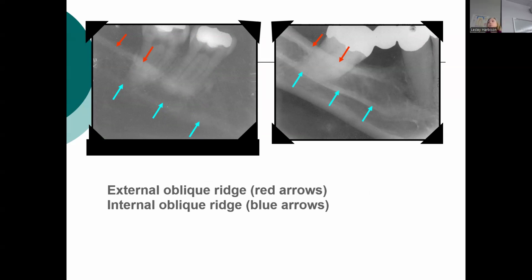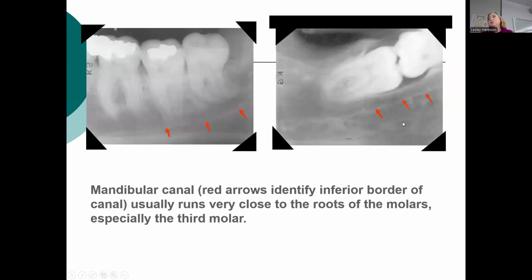Again, kind of a weird picture because there's a lot of bone loss there. This was probably an older person who has had a fair amount of bone resorption, so everything looks much thinner. But you have fairly prominent ridges because it's the thickest area of bone. As they've lost bone through the years, this is still going to be the thickest area of bone, external oblique ridge and internal oblique ridge. Then you can see how thin it is down below; the inferior border of the mandible is very close to their teeth. But it's a very strange angle that they took the picture at too.